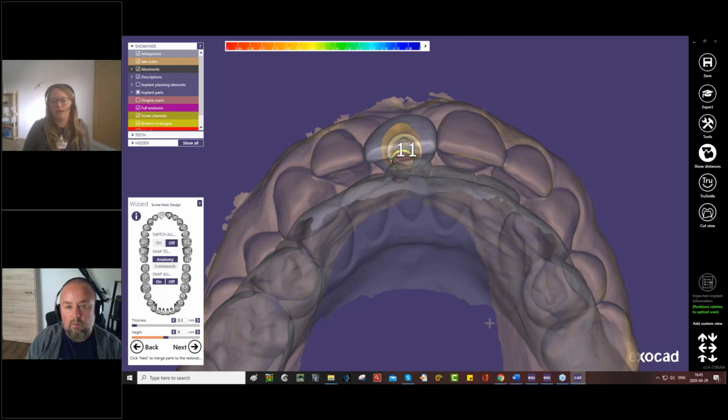And then in the guide creator, you can add a marker. I didn't do this now because it wasn't necessary here. You can just choose to add a marker during the design of the material around the sleeve. And you can choose if it's going to mark the hex pointing to the vestibular or to the edge or to the flat part. You can choose to mark one of them, or you can choose to mark all of them if you want to.